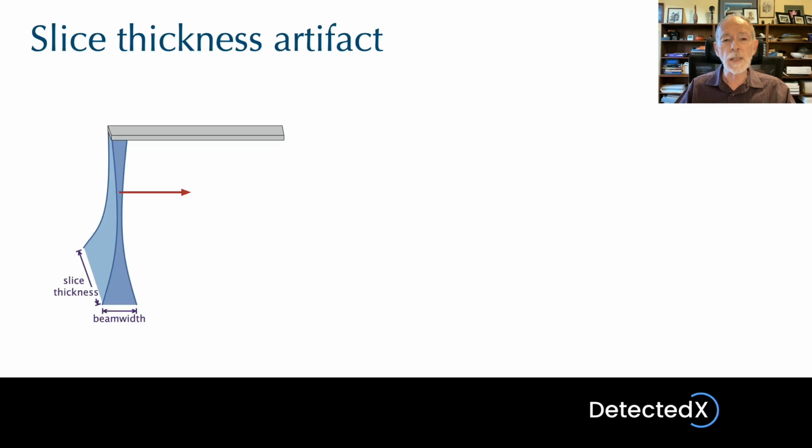And now we're looking at slice thickness. Just to remind you, this is the dimension of the beam across the width of the probe. So it's a dimension of the beam we don't always think about. When we're talking about the focusing of the beam, we're thinking of the focus as viewed in the scan plane. But this is a dimension of the beam at 90 degrees to that in what we refer to as the elevation plane or the slice thickness plane.